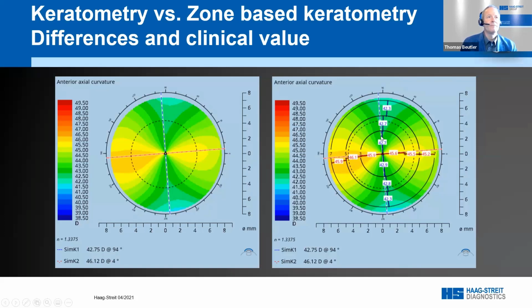In the center, they are on top of each other. We also see that the 2 lobes are almost identical. And we also see that in the periphery, they are almost in line with the original. Because we have always some asymmetries, we see that for the outermost zone, we have a little discrepancy, but this is not so much of use because the IOL will never cover this area.